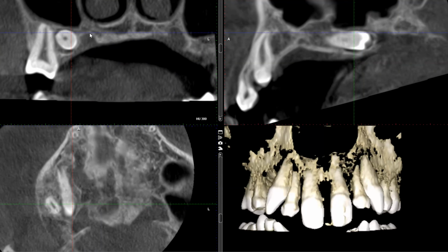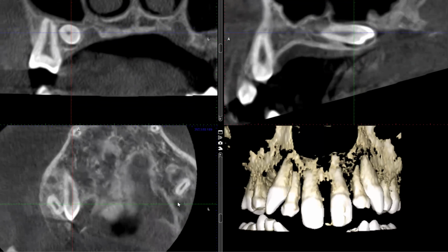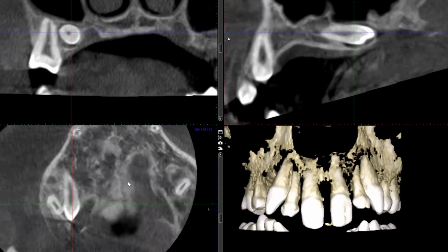Unless you see different signs of erosion and obviously clinical examination as well, most likely these concavities are normal anatomy. Anyway, so here's that horizontally impacted premolar, most likely tooth number 4.